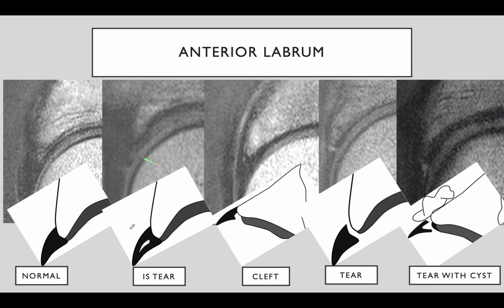Now moving from the osteostructures to the labrum, it's important for you to remember that we can see the anterior labrum really nicely as this triangular beak-like structure. And here it is. And for those of you who can't remember what a beak is, just draw a bird around it, and that's what it is. So a nice black beak would indicate that this is a normal labrum.